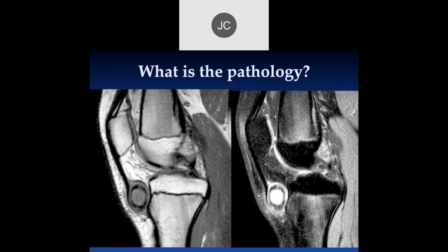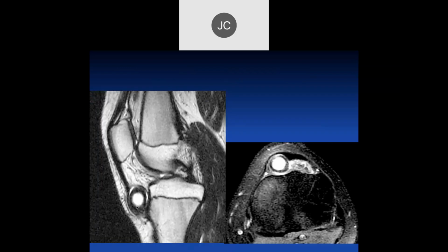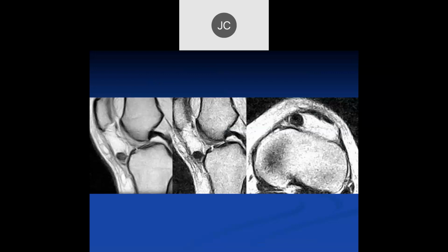So this patient was actually sent up to Stanford where they removed this. And this was a synovial chondroma in the infrapatellar bursa here. That is funky. Okay, so this is this case. This is in an adult. That was in a child.